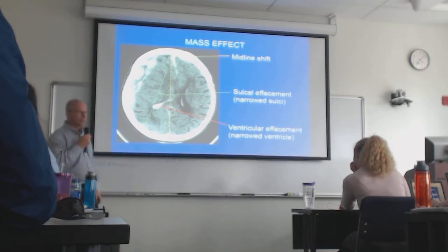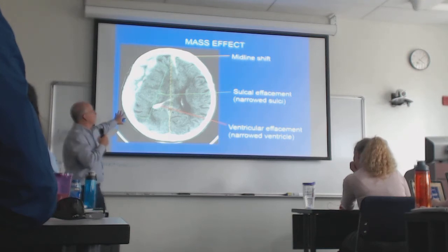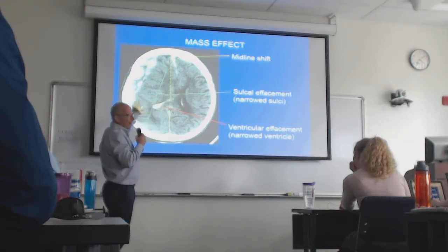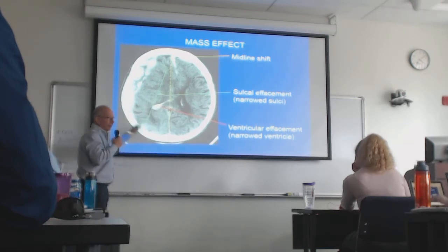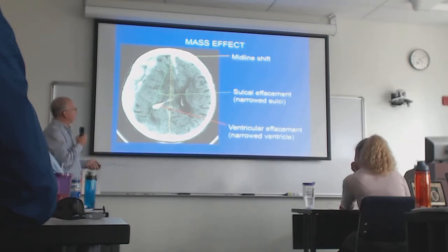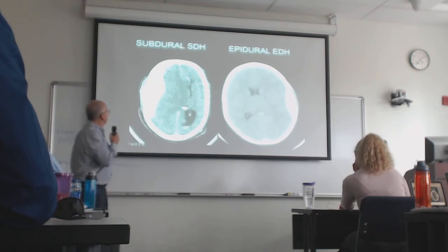Is this a significant epidural? Yeah, the epidural doesn't look big to me. Oh, I'm sorry, the epidural. At this moment, no. Correct. Right now, the action is on this subdural side. Okay, I beg your pardon. You're right. No problem. I think I'll show you a more significant one. Oh yeah, that one's a little better.